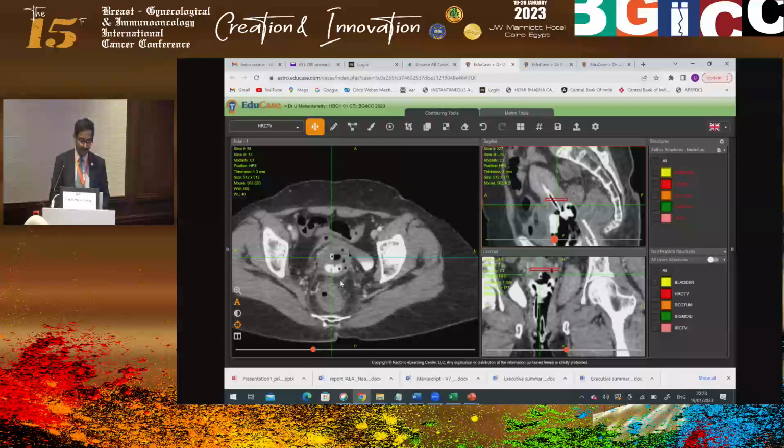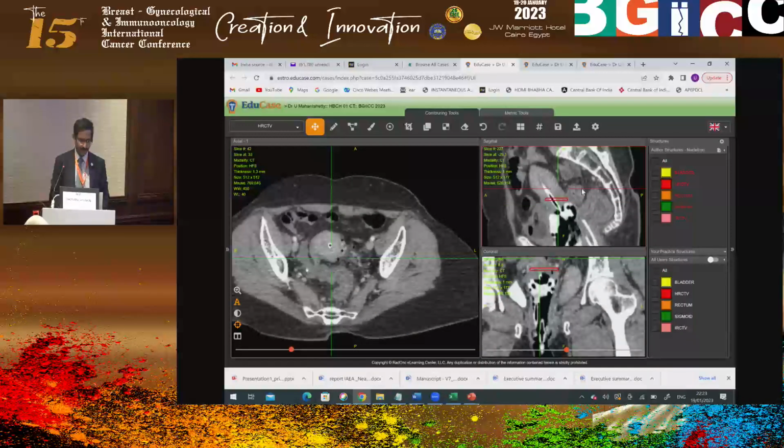So for example, here I would go at this level, right, and I contour, so I would contour something here. Can you see that here? But posteriorly I have overestimated, so I'm just going back.